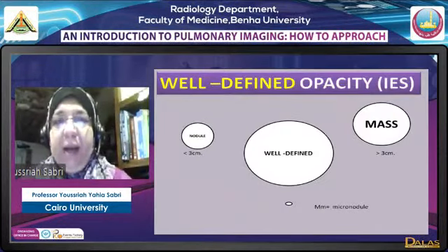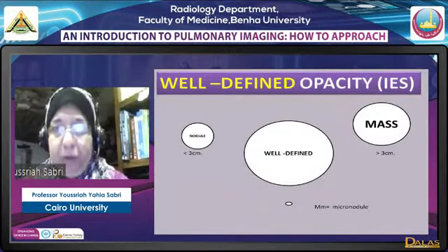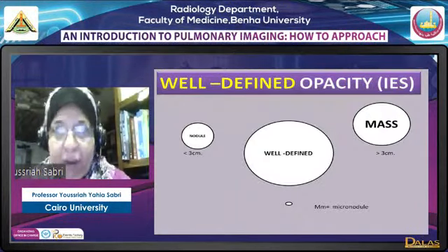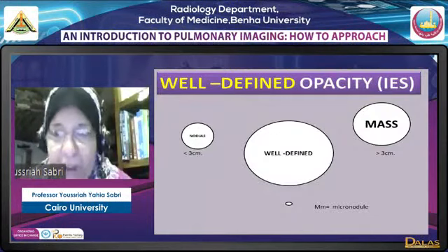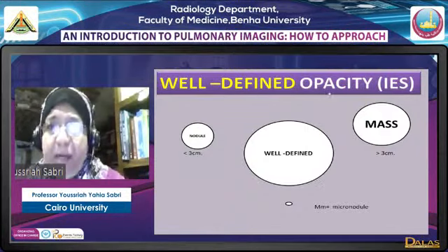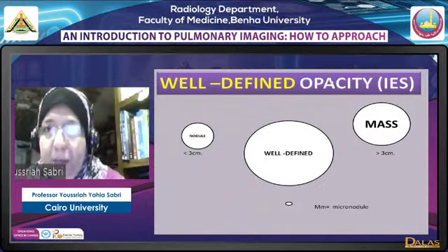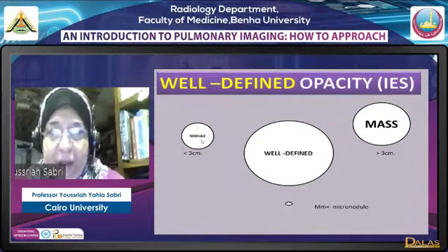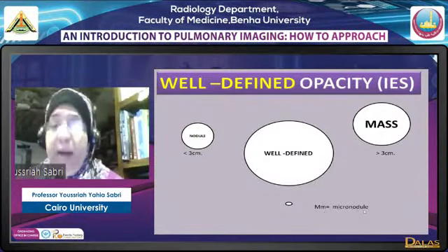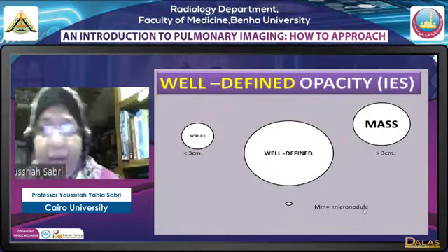طيب الليجن اللي احنا هنتكلم عليه we're going to describe now, we're going to discuss اللي في دماغنا دلوقتي انه I'm discussing a well-defined lesion. Well-defined lesion اللي we are approaching is I'm dealing with a circle, I'm dealing with a round lesion. well-defined اللي هنبتدي بيه هي well-defined opacity lesion أبيض and rounded. If it's more than 3 centimeter I'm discussing a mass, less than 3 centimeter I'm discussing a nodule, millimetric I'm discussing a micronodule. A millimetric هنا I mean about 3 to 7 millimeters تقريبا.